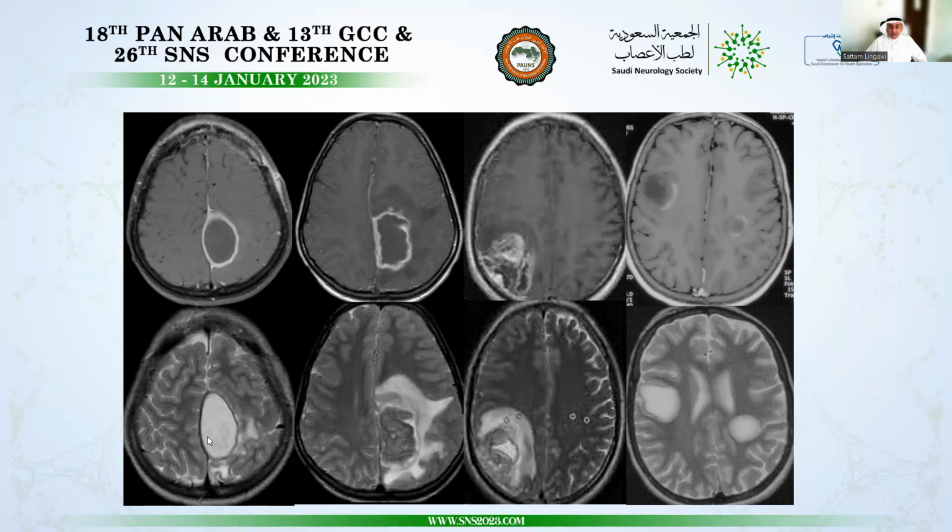This represents a bacterial abscess. The lack of increased signal intensity around it, minimal edema, is due to the start of antibiotic therapy. So this is the classic appearance of a bacterial abscess: a smooth ring enhancing pattern with high signal intensity center on T2 and a clearly demarcated capsule. Usually surrounding edema is seen in the early stages, and the edema regresses with treatment.